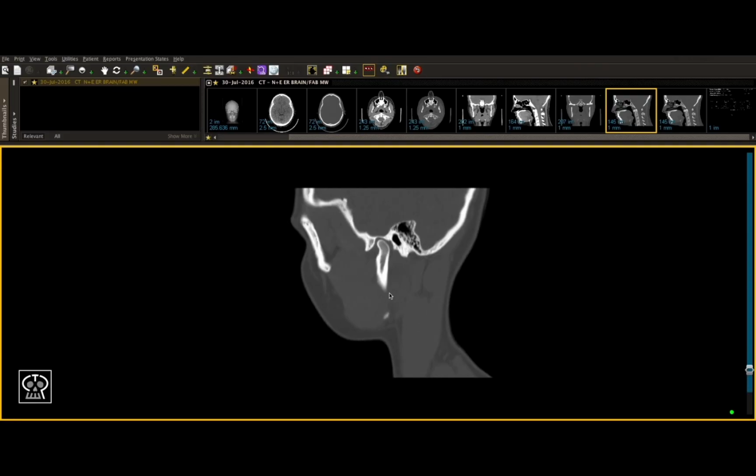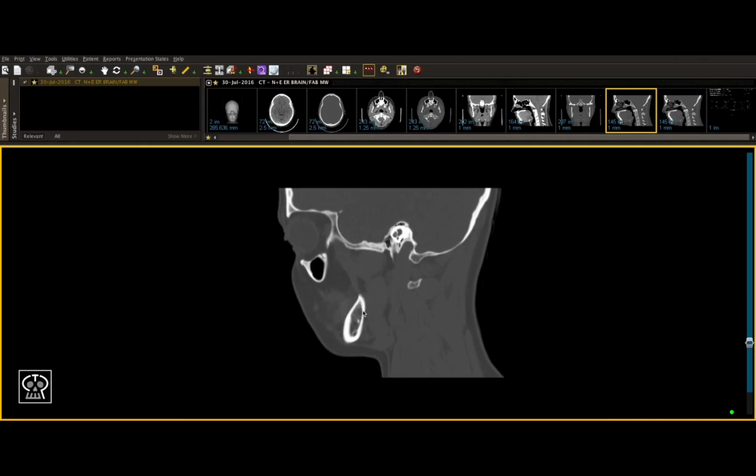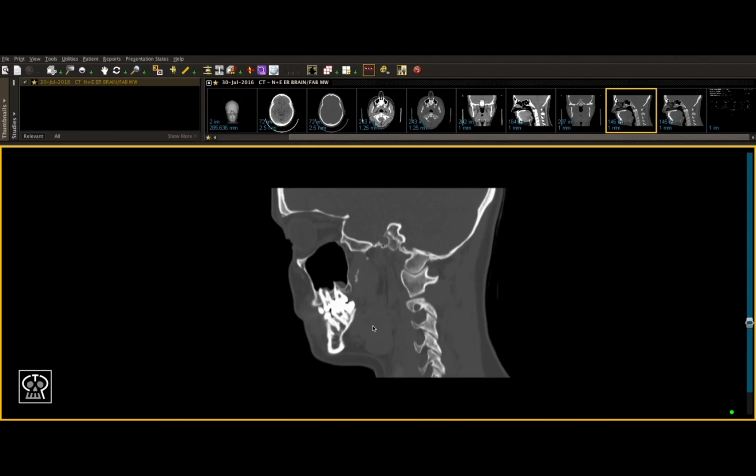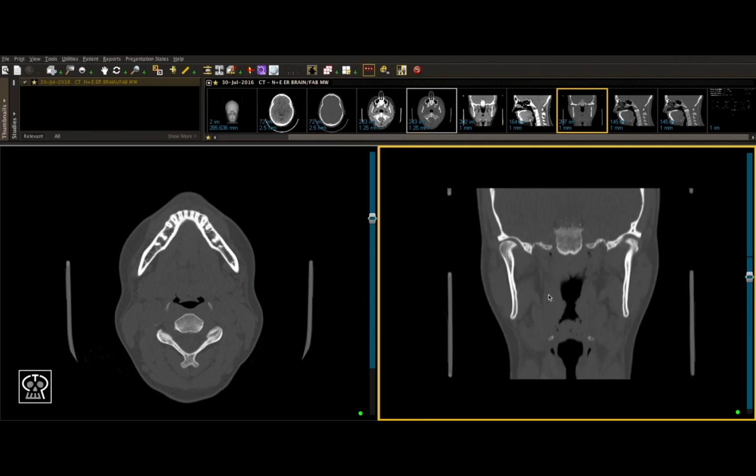Although it'll be obvious once we start looking at some fractures what exactly you're looking for, as I mentioned before, any breaks in the cortex is a red flag and should warrant further investigation. The last thing we need to touch on is multiple views. As I said before, combining views like axial, coronal, and sagittal views is very helpful.